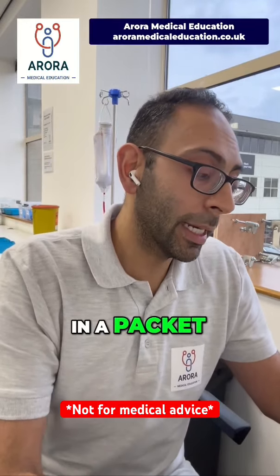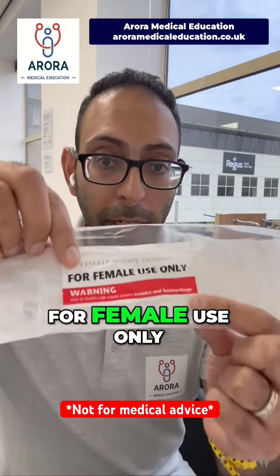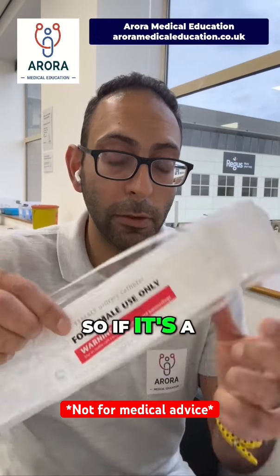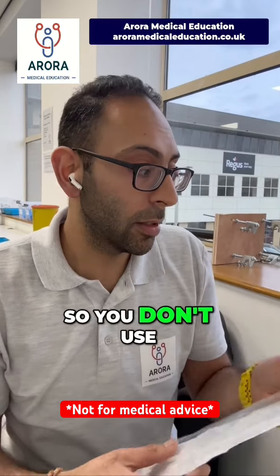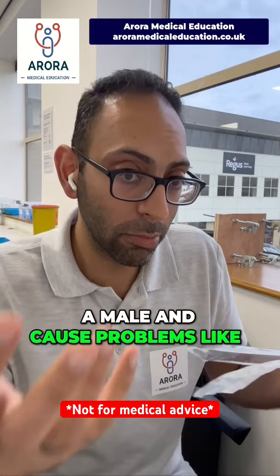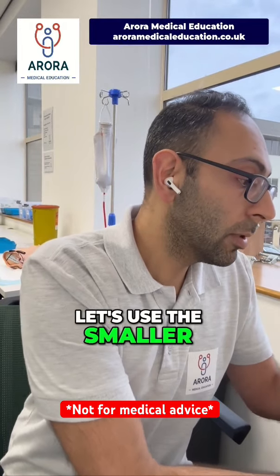You might get it in a packet. So it's going to come in a packet like this. Notice how this one says for female use only. So if it's a female one, it generally will be pretty clear on why it's a female one. So you don't use a female one in a male and then cause problems of pain when you blow up the balloon. Okay, so let's use the smaller one to show you that.